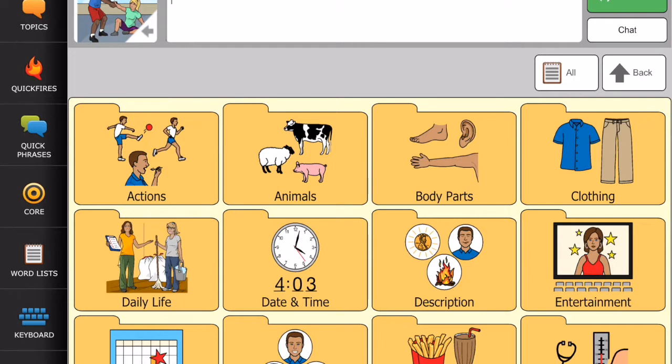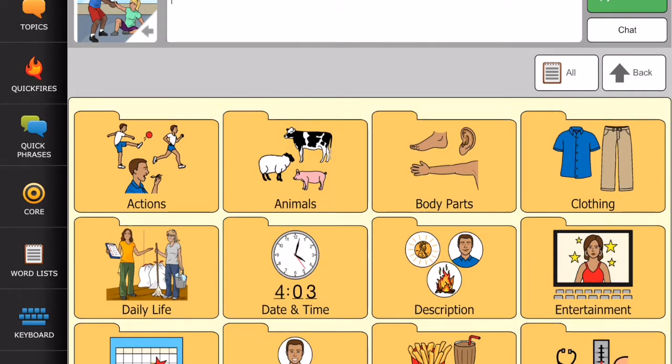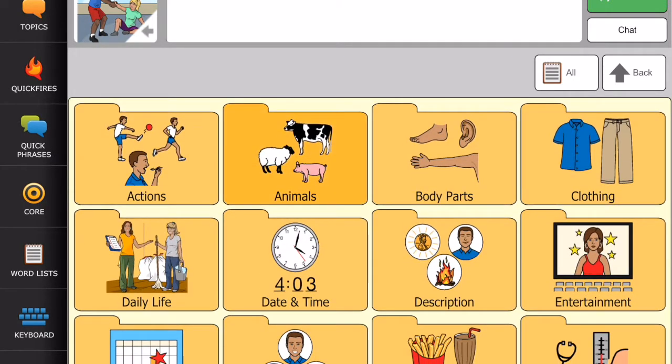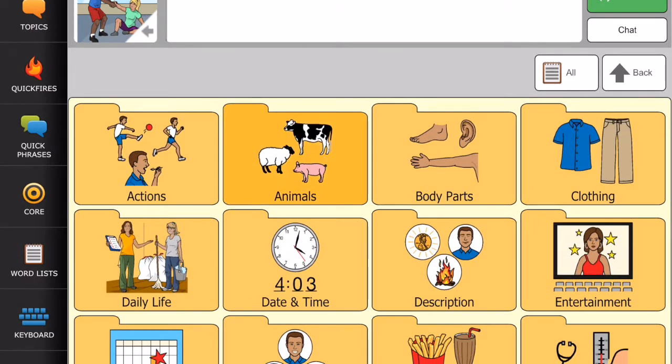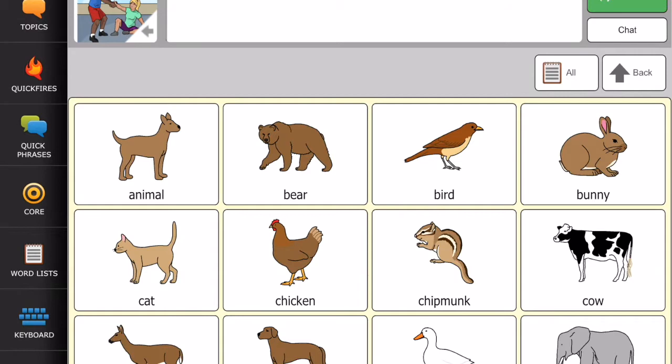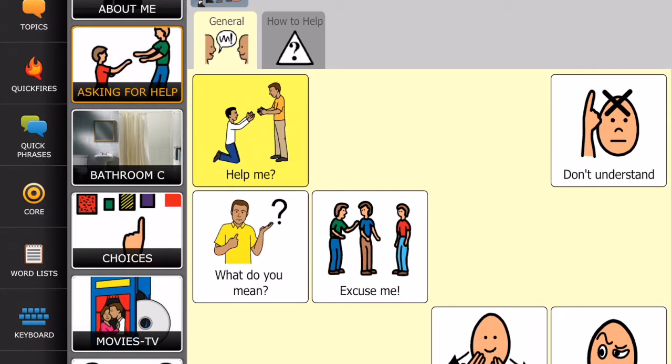And I also did not like that you couldn't move the folders or buttons to different areas. In other programs, when you hold it down, the button's easily movable, but here when I hold it down, it just opens the tab. Something that I didn't really like about the program.